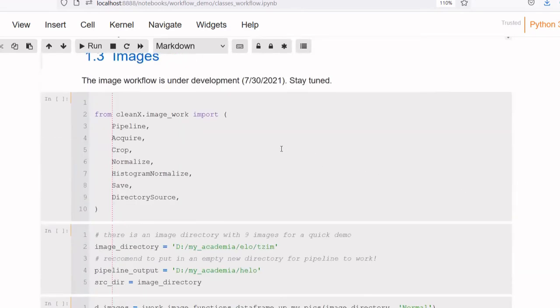The images also need a closer look when you are creating a quality machine learning algorithm. It is absolutely essential to crop away black frames around the image, but you may also want to normalize your images or perform other steps that will pre-process them. So these steps can be performed with the pipeline.